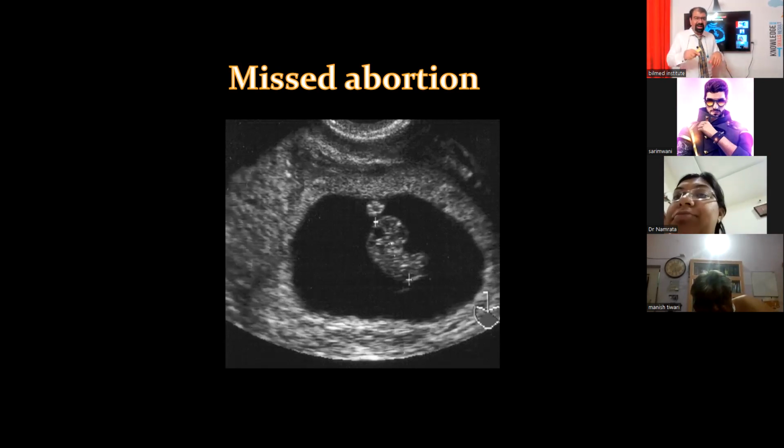I will rescan that patient. If fetal cardiac activity is present today, there are high chances that it will not be present tomorrow or a day after tomorrow. Because the yolk sac is telling me that my walls are calcified, so I am an abnormal yolk sac. Please consider me in your diagnosis.